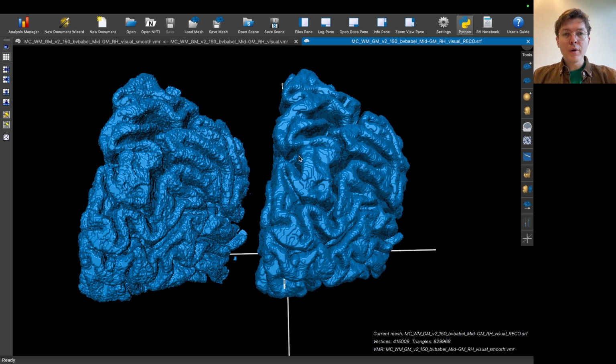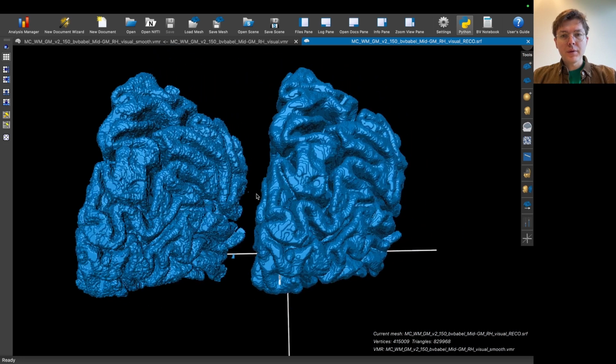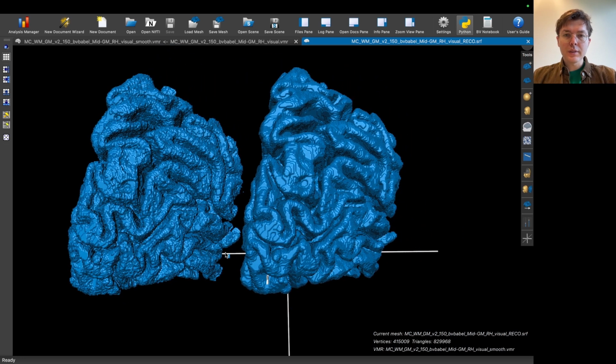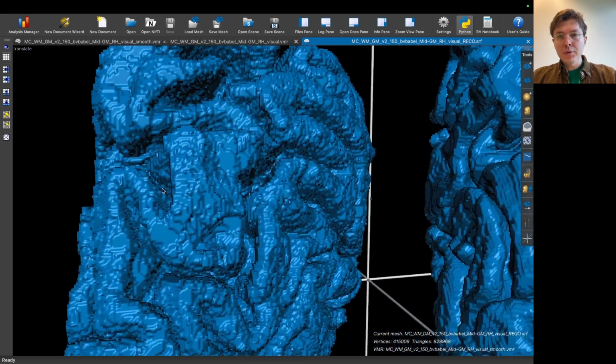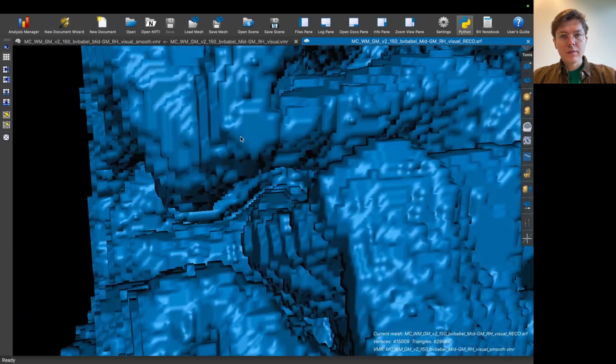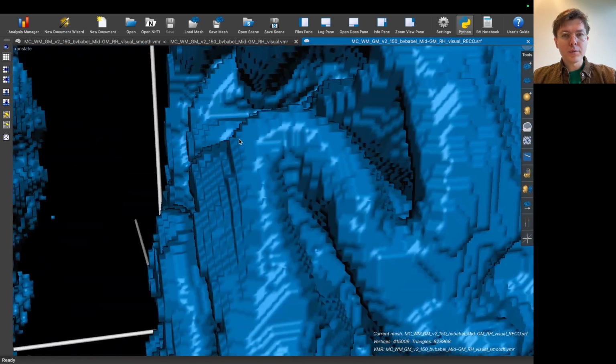Whether your smoothing worked, whether you smoothed too much or too little, you can look at this and optimize the parameters. For instance, one thing to notice is that the floating piece that was hanging around here is completely gone. That's good for us. And this crumbling visuals, these voxel shapes, are mostly gone. They look much more smooth.